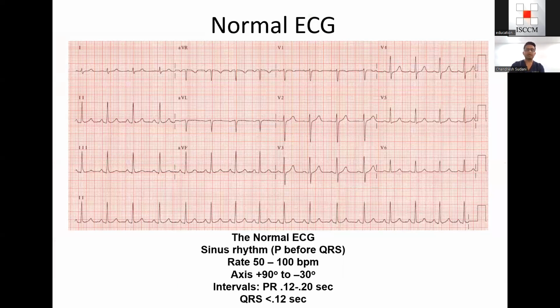Now, this is a normal ECG which shows all the leads, starting from leads 1, 2, and 3. Apart from that, there will be one separate lead 2, where you can count the RR interval and regularity. While reading a normal ECG, you should always decide how to put in sequence all the waves and intervals.